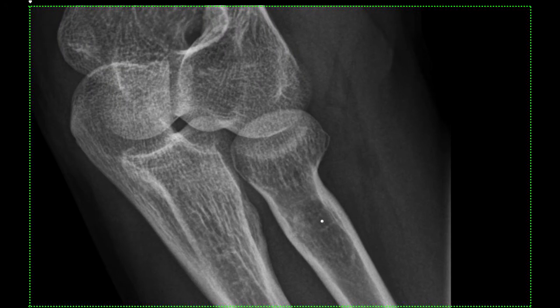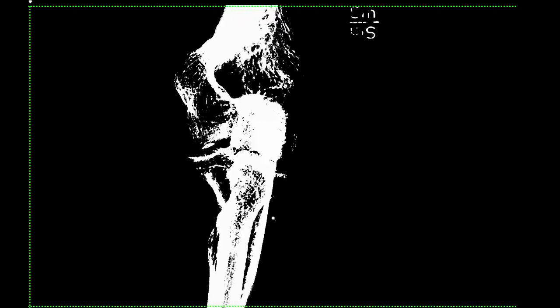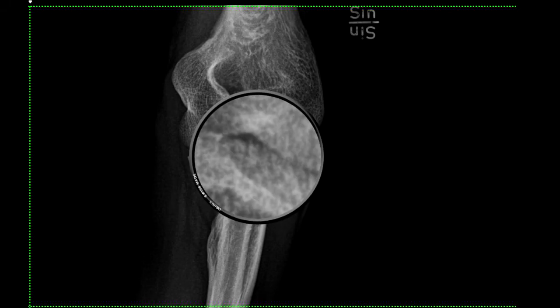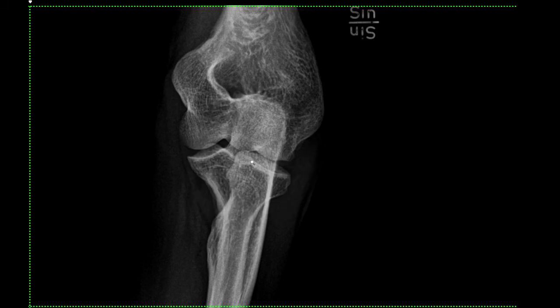Nothing. It's amazingly difficult to see. Here, if we play with this a bit, you might see it better. You can also see something going on here. It's a bit strange up there. Yeah, you see that middle part. Good one, guys. Let's do more cases.